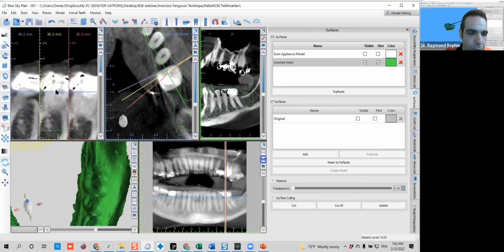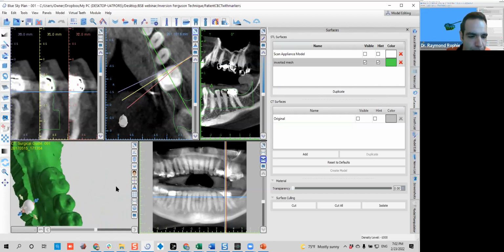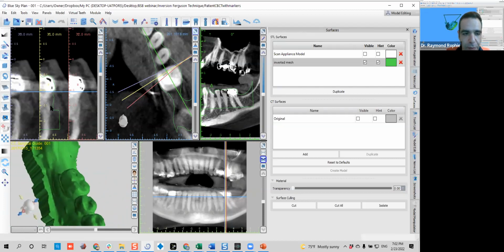So here you can see that there is this straight line that will, okay. So maybe nothing happens if I don't cure it. However, if I don't take care of this and I create a surgical guide, for some reason, it could be very tight in there, right?